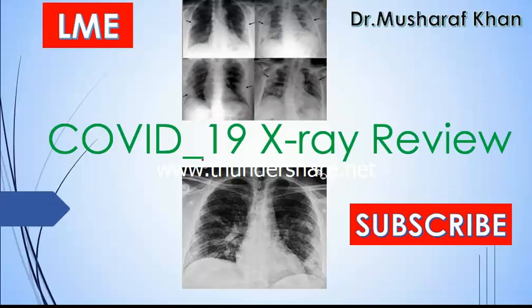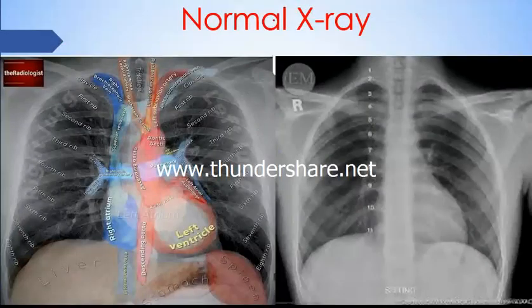So in today's video I will explain the COVID-19 chest X-ray review. But before that, before I explain the chest X-ray of a COVID-19 patient, I want to explain the normal shape of a chest X-ray.